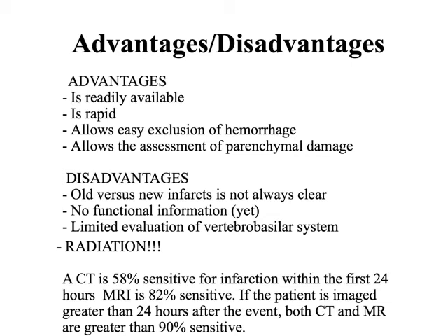It allows for an easy exclusion of hemorrhage or trauma, and it allows for assessment of parenchymal damage. But there are some disadvantages. We have a hard time determining if it's an old versus a new infarct.